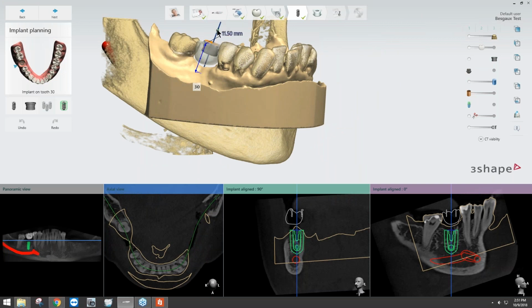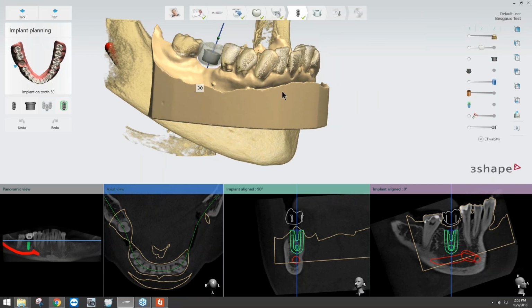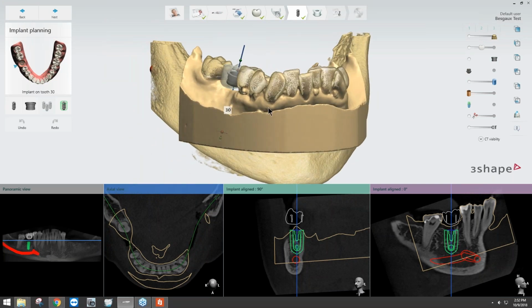Right now, I don't know if that's by design or not. There were older versions of Implant Studio where even a copy of the case would not allow you to make changes. So the only other way to confirm that you can always go back in and adjust it is to make a copy of the case before you confirm that approval. As long as you do that, even once you approve it, you still have the copy that you can go back to.